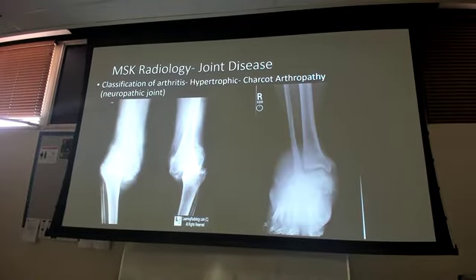we haven't seen anything like this yet. This patient's going to walk into your clinic. That's almost like not even on the tibia, right? That is definitely subluxed off of there. There is no joint space. This is called Charcot's arthropathy.